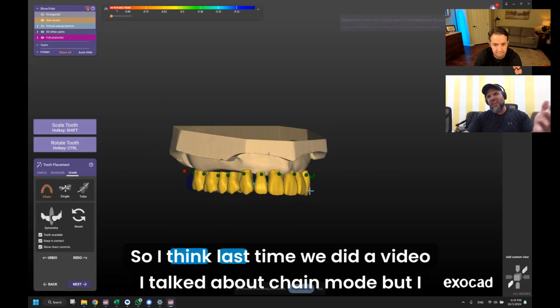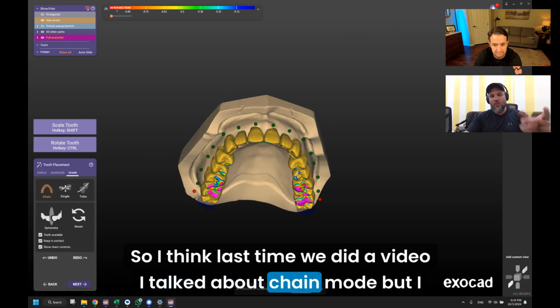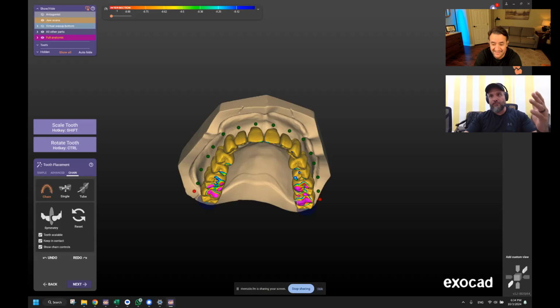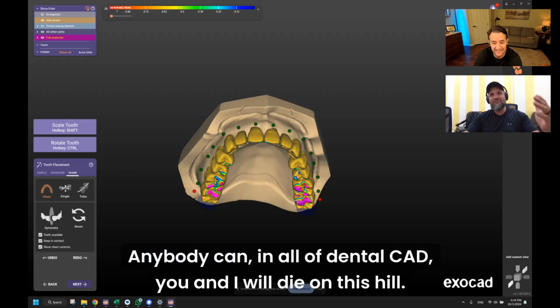So I think last time we did a video, I talked about chain mode, but I believe this is the best tool in all of CAD. Oh, really? In all of dental CAD. That's a bold statement, brother.